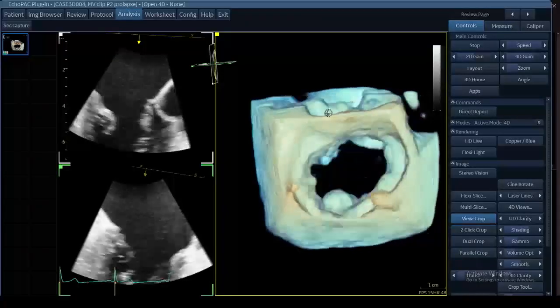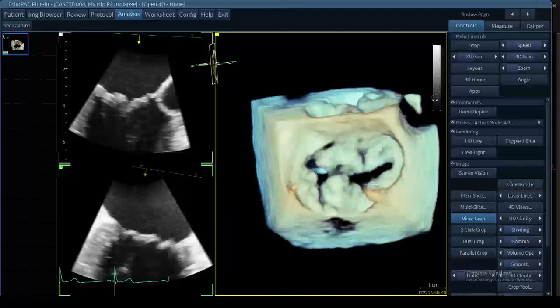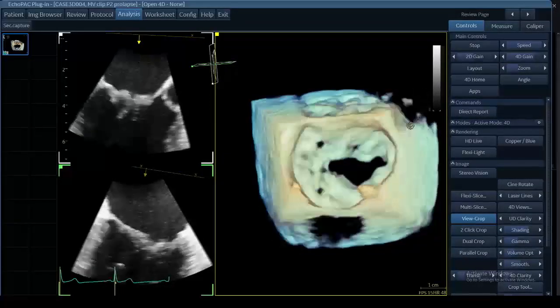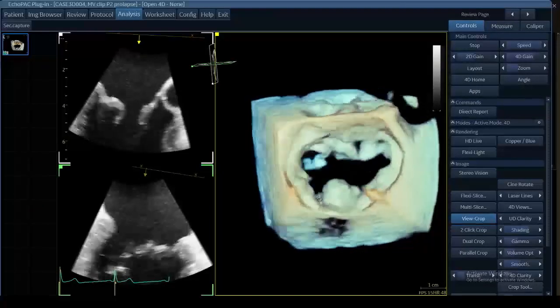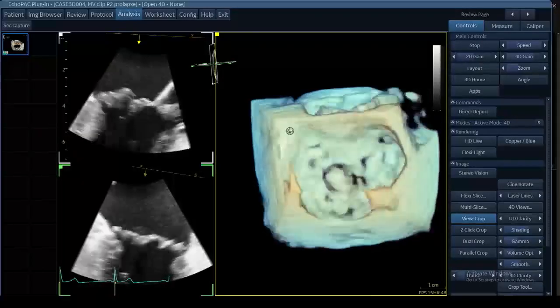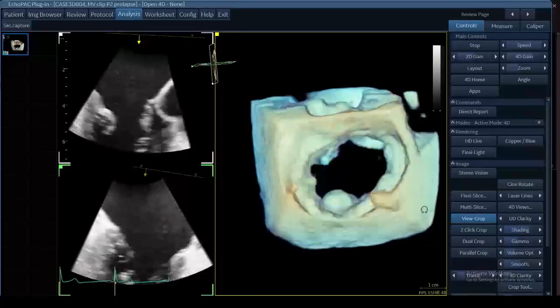In this case, typically the aortic valve is here at noon. You have the tricuspid valve up at this level, maybe around 1 o'clock. You have the appendage here, maybe around 10 o'clock. And this is the interatrial septum. So mitral valve, interatrial septum, tricuspid valve, aortic valve, appendage. The coronary sinus runs here behind the posterior leaflet.